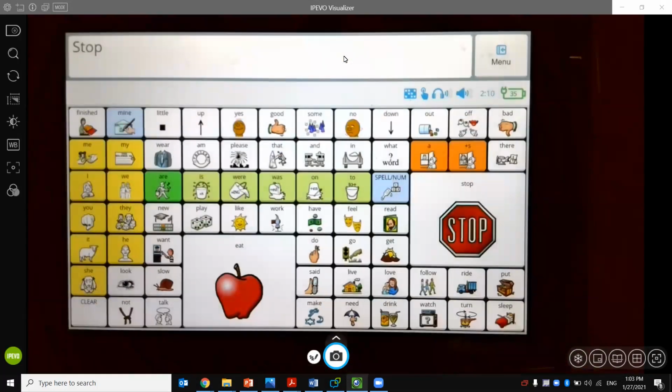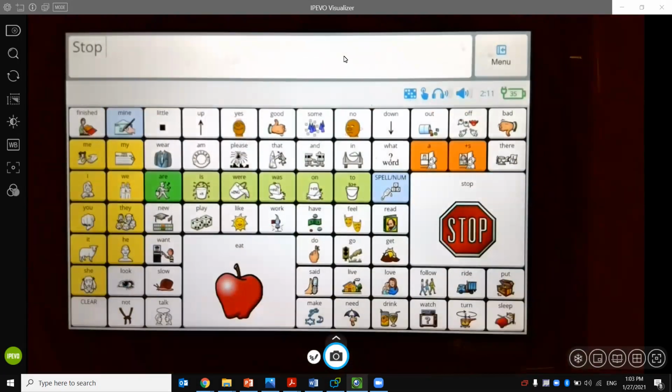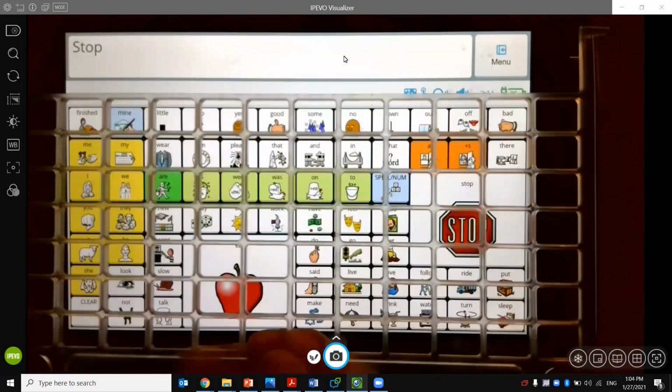But anyway, you've got to a spot where you're in a consultation usually, and for some reason you have a child who's not motivated to touch the buttons. So one trick you're going to do, and I want to be very strong about this, is don't do this without the 84 key guard on there. I'm not snapping it off and on. When you hide everything with these two buttons, I want to make sure you leave the 84 key guard on there.